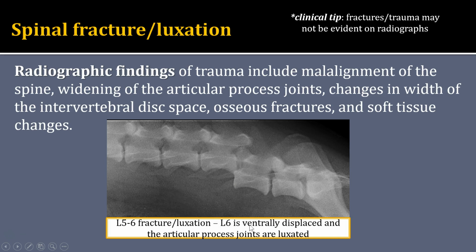This patient also has some retroperitoneal soft tissue swelling that may be a combination of hemorrhage and even potentially urine. So it's not uncommon if you have caudal abdominal trauma that we may have distal ureteral trauma, or remember that the urethra is partially enveloped by a reflection of that retroperitoneal space. So urethral tears can lead to retroperitoneal urine accumulation.